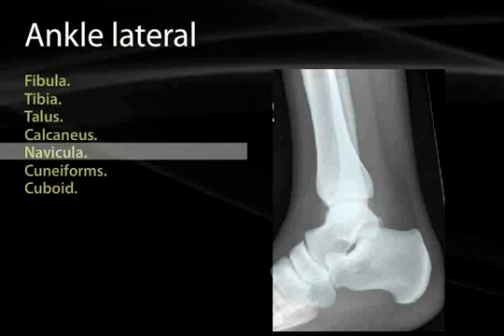You have a nice navicular bone, and that's boat-shaped. Look for nice edges along this. Also, you can see very good joint spaces between each of these. They're nice and even, so nothing's being jammed up against the other one, which can be an indication of problems. They don't look fallen, which can be an indication that they might have arches which are degenerating.